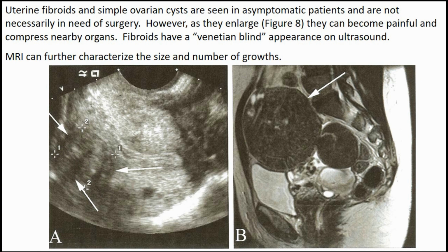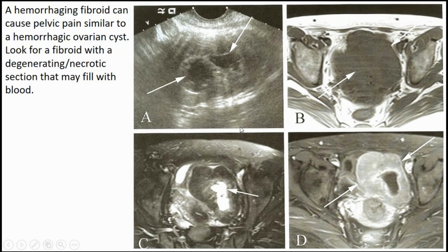And here the physicians got an MRI. You can just see this monstrous fibroid right here sitting on top of the bladder. That can't feel great. And we've got the abdominal wall here being pushed forward by that fibroid. Probably a little bit of a secondary growth back here. So just be aware, one imaging modality is not all you have to work with, but CT or ultrasound in the abdomen and pelvis tend to be a good starting place.